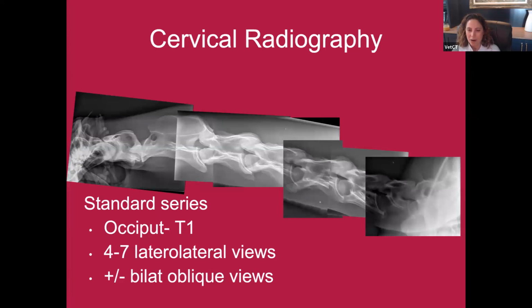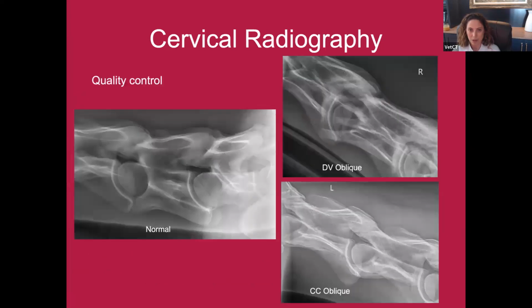From there, oblique views are, for me, something I add on as needed. Anytime I add on oblique views, I'm going to add on both sides. So it adds a lot of time and a lot of work, but I really do feel like it can be super valuable, which we're going to get into shortly.